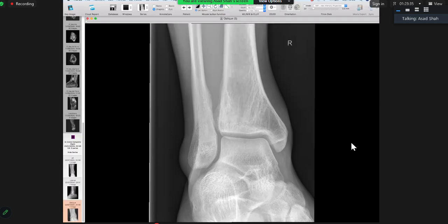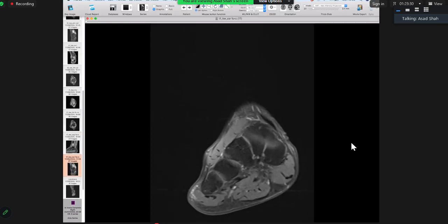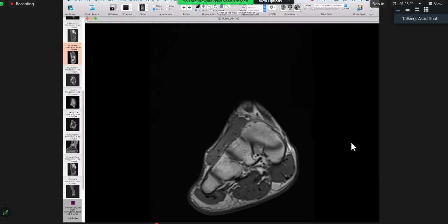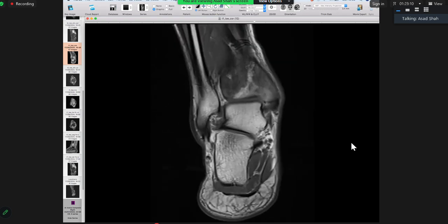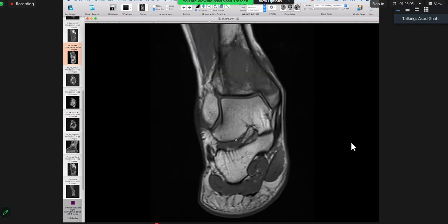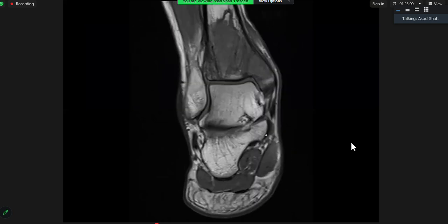All right, okay. I'll probably start with the T1 actually. So that's a T1 coronal. I don't know if I can give you the control. Let me see. I have requested remote control. Approve. Okay, let's see. You can scroll. Oh, great, it works. If you double click on it, you can scroll through it for all of us a few times and then we can describe.